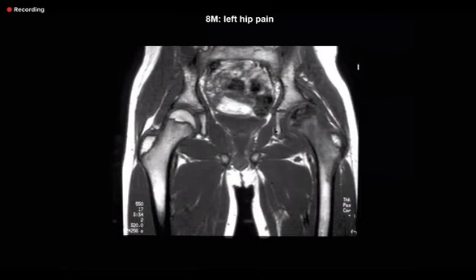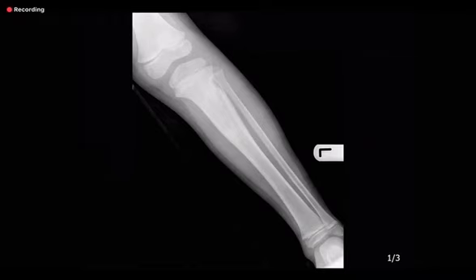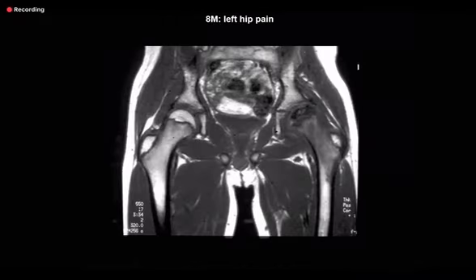Easy, just give me the diagnosis. Sorry. Are you with us, candidate? Yeah, yeah. So this.